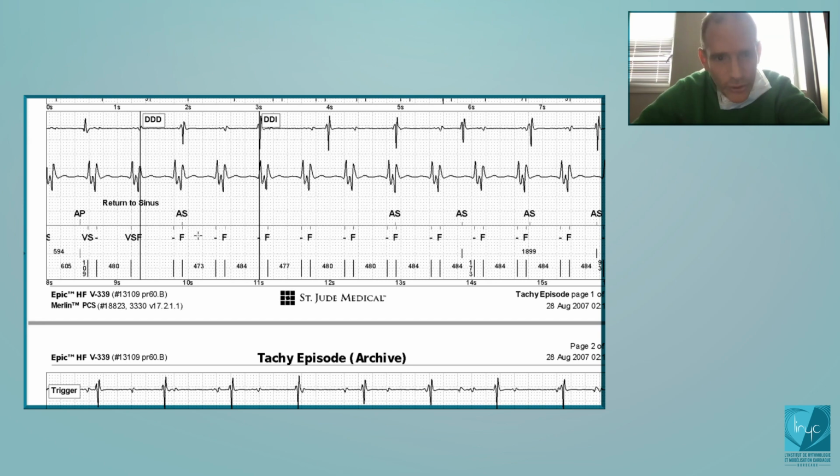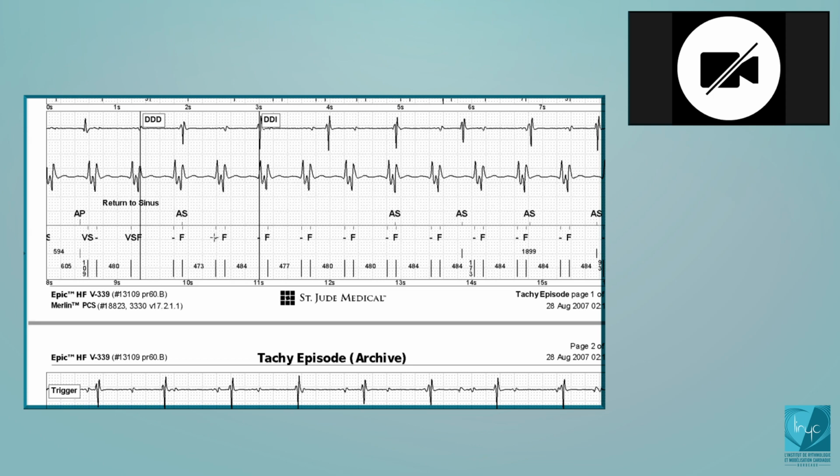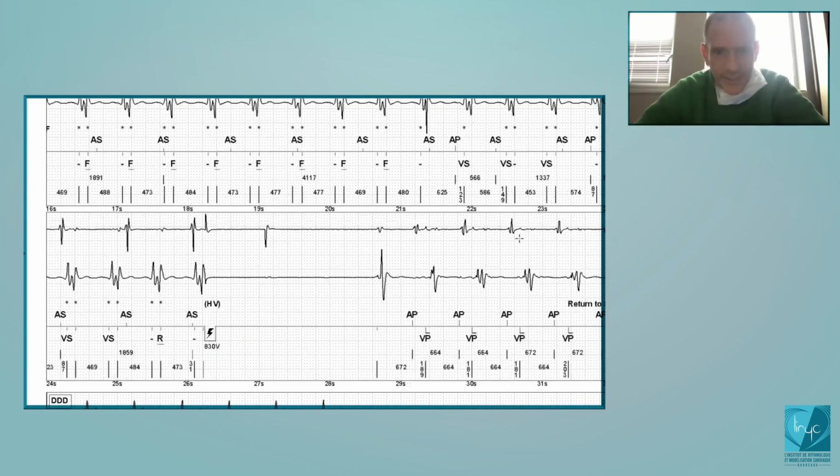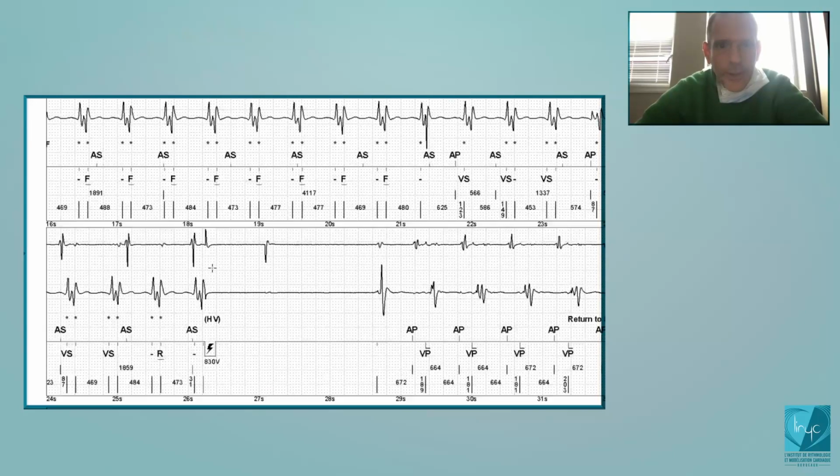Is this clear? Because of the way you're counting, this cycle is long but is considered unclassified, because the average value of this plus this plus this plus this is still in a zone of tachycardia. You understand? So it's considered unclassified, and therefore you will not decrement the VF counter, and it will be incremented, and then at the end, the patient receives an inappropriate therapy.